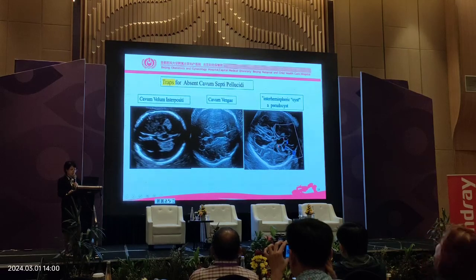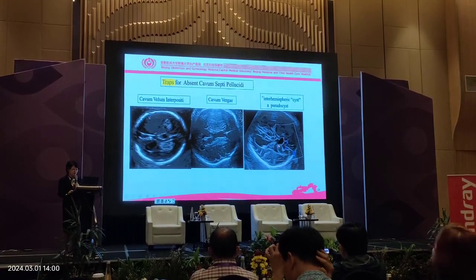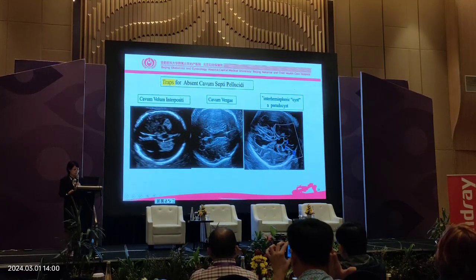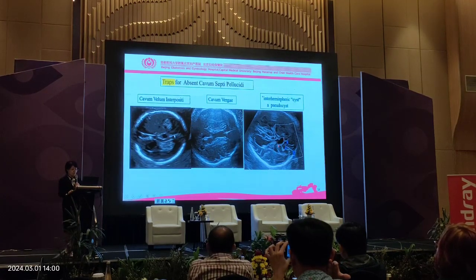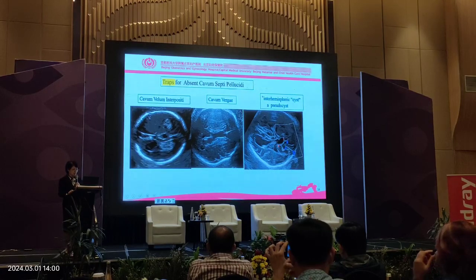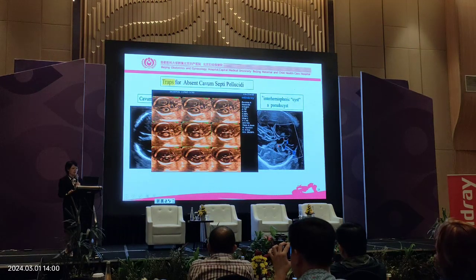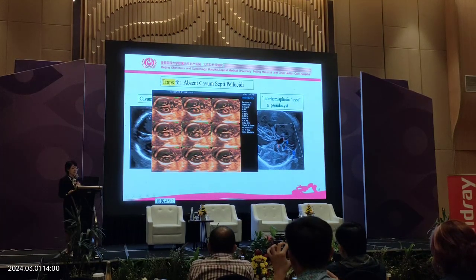The cystic structure in the midline is due to a deficiency in the roof of the third ventricle and results in agenesis of the corpus callosum. This one. So we should take care regarding destruction of white matter. In these pictures you can also see a cyst, but it's different. It's both choroid plexus, on both sides of the cyst. These pictures.